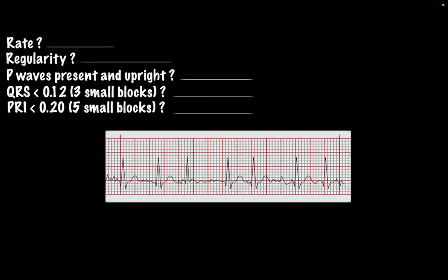Now, this rhythm, unlike the last one, is one that you're going to commonly come across in EMS. And at a quick glance, even if you have no training, you probably see a few things off. So let's follow those 5 steps and see where it takes us.